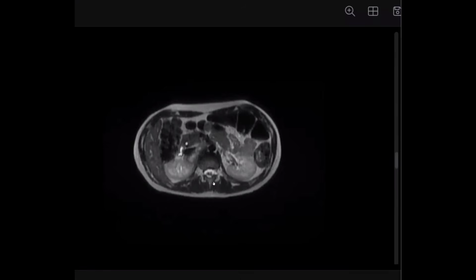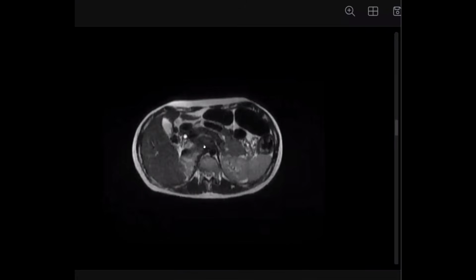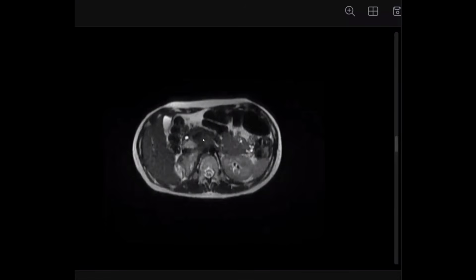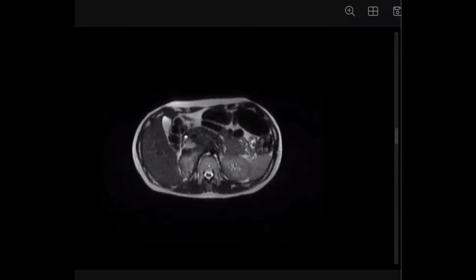Okay, this is an MRI for the same patient. The lesion displays mixed high signal and dark signal on T2 weighted images. So this can be retroperitoneal fibrosis also, because fibrosis is maybe low on T2 weighted images. Is this one the classic space for retroperitoneal fibrosis? No, it's not classic. It is usually bilateral, para-aortic, not only in the aortocaval region. Yes, perfect.